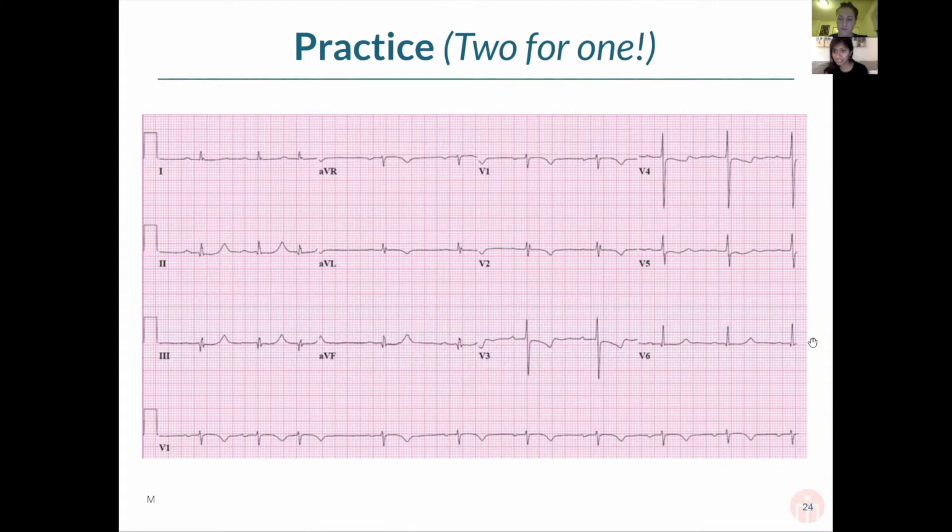And one person has correctly identified we have sinus bradycardia here because, again, you're seeing a P before every QRS and you're seeing a QRS after every P. So that in and of itself tells you that you have sinus. The big thing that we really want to look for here, because we're looking at bradycardia, is what we're seeing in terms of the PRs, and the P in relationship to the QRS. So what we can see here is that the P and QRS complexes are a little bit further apart.